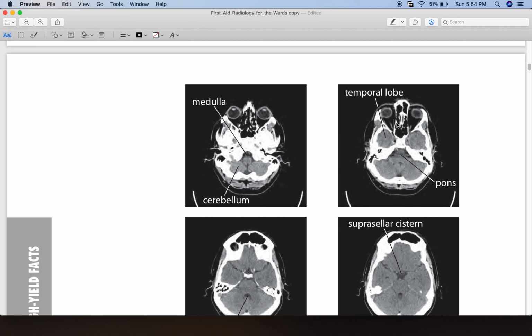Okay, on this next picture, we can see this thing in the middle. Before we talk about the structures, what is the key feature about this picture? How do we know which level this is? We check a structure. This thing here, now the cribriform plate of the ethmoid is finished. Here we have the vomer bone. This is the beginning of the formation of the nasal cavity, and later on it becomes the nostrils and everything. And still we have the eyes, but some other things are present here.